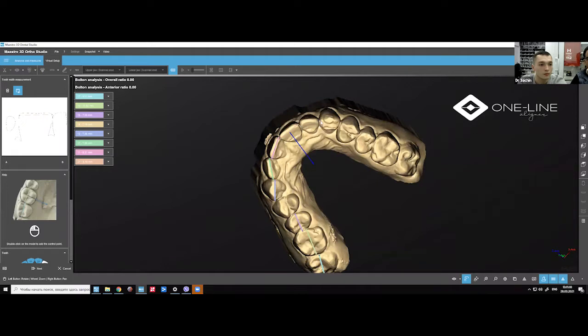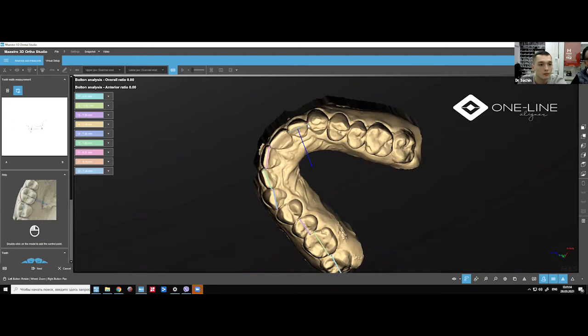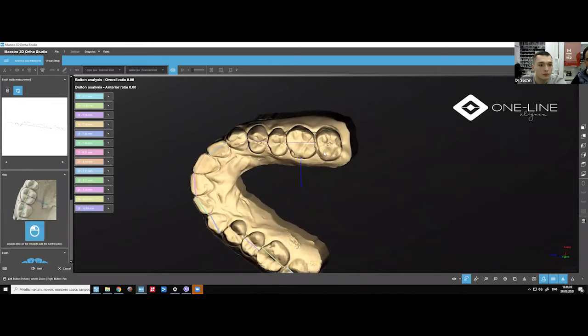And he can show you some of the points which might not be clear when you're doing segmentation, especially cases in which you have spaces. And in those spaces, it's difficult to do segmentation with the Maestro. Maybe I don't know about the other programs, but with Maestro it becomes a little difficult. So we'll just see how it goes today with this segmentation.